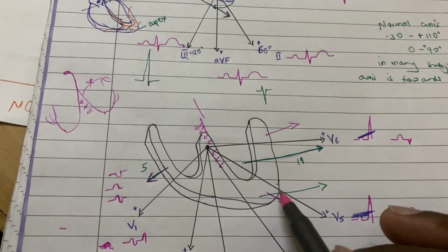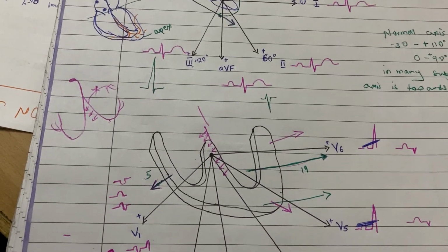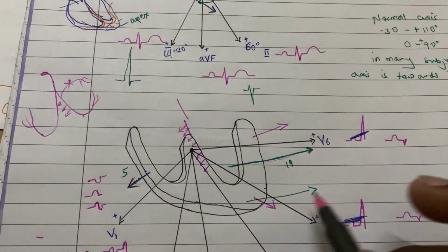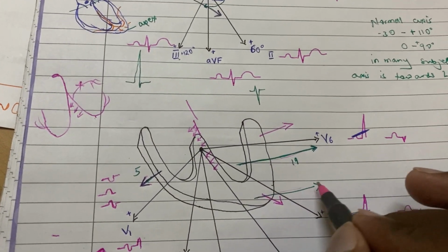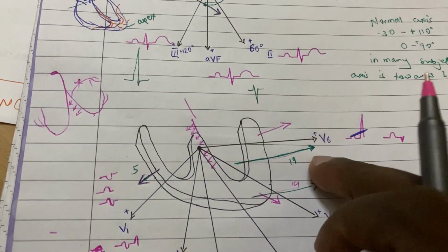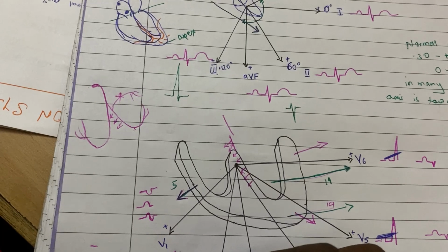The net should be 19 minus 5, larger minus smaller, and the remainder will be 14 going this side. So this is the 14 remaining going the other side. So we are taking this net, not this 5, not this 19. This net is moving away from V1, so it is negative.